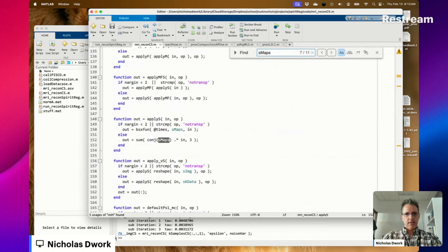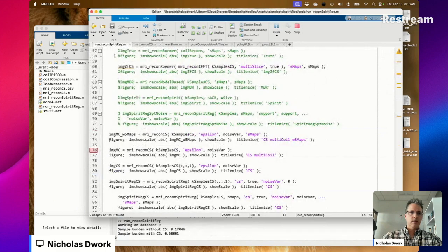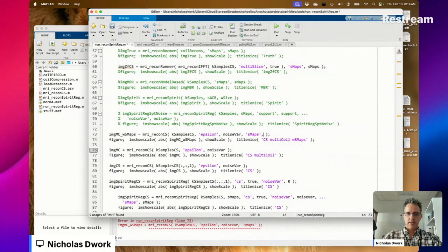I think the answer is just this. Nope. Oh, I forgot to supply S maps.